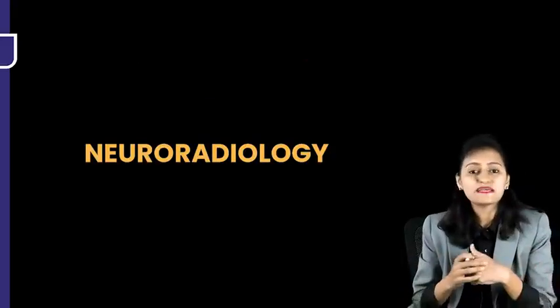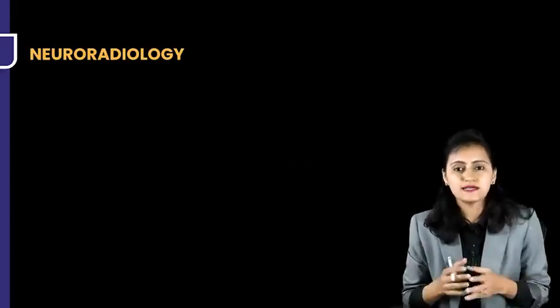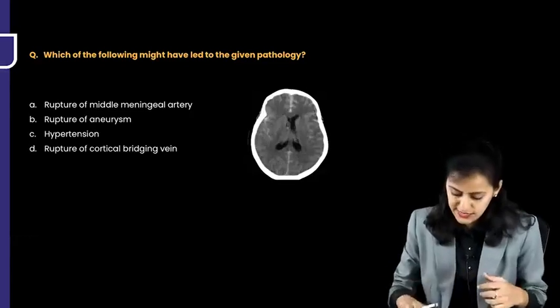Now, the next segment that we are going to discuss is neuroradiology. So now we are going to discuss neuroradiology. So which of the following might have led to the given pathology? What do we see here?